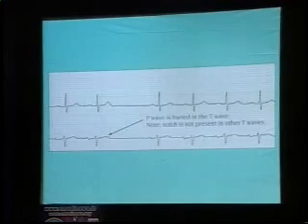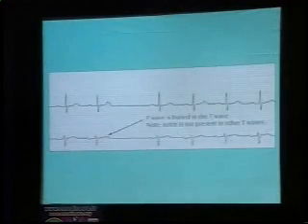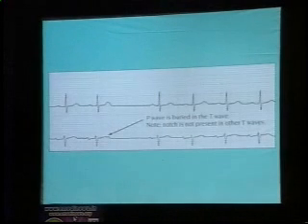This pause is not a pathological pause. This is only because of a premature atrial complex which is coming and blocking into the ventricle. It's not conducting down into the ventricle. So you have so many patients who have respiratory disease, who are smokers, who are on some kind of steroids. I mean, any catecholamine surge can cause a PAC in a patient. So all these patients are not candidates for pacemakers.